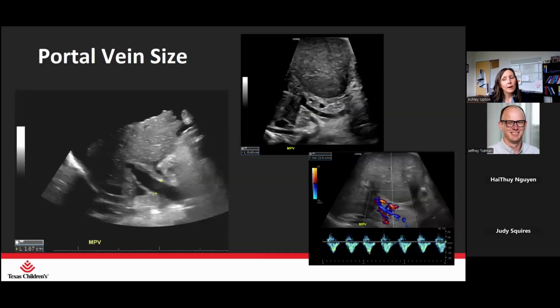And with significant portal hypertension, the portal veins become enlarged. Criteria for an enlarged portal vein in adults is between 13 and 15 millimeters in the literature. Now, I do want to caution you a bit. There are some instances where the portal flow is so poor that the portal vein is no longer enlarged, but it becomes really small. So this is a case, it was actually a biliary atresia patient that had significant portal hypertension, but notice how tiny this portal vein ended up getting. It's blue, it's reversed, and it's also pulsatile because the adjacent artery was reflective in the waveform.